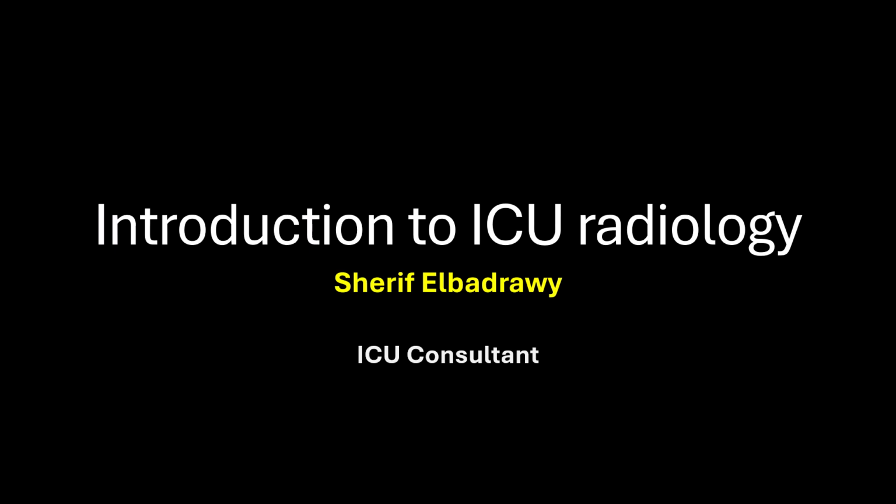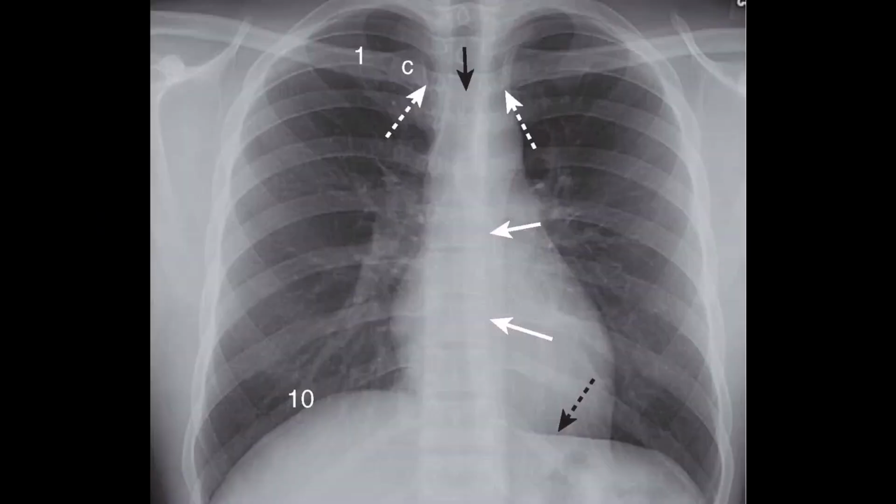Today we are going to discuss an introduction to ICU radiology, especially talking about the chest X-ray: how to read a normal chest X-ray, and how to spot certain pathologies. So this might take more than one video. Okay, so this is a normal chest X-ray.